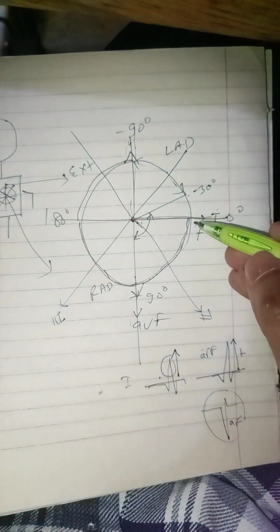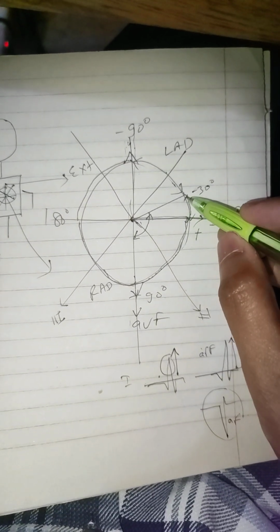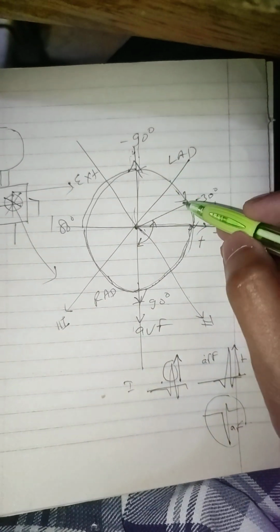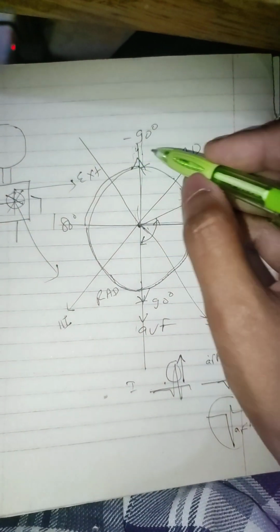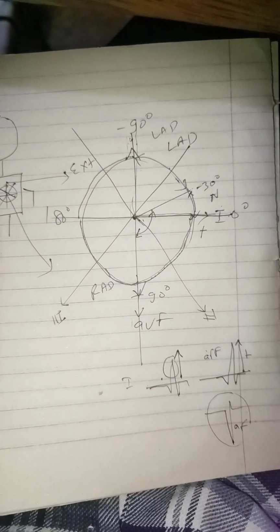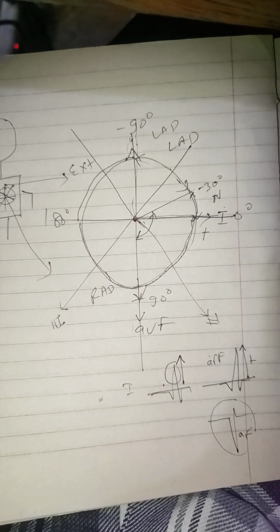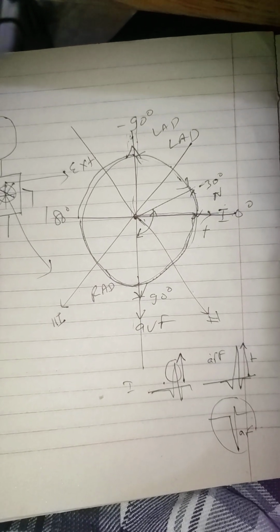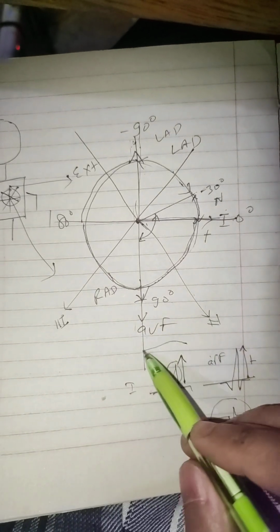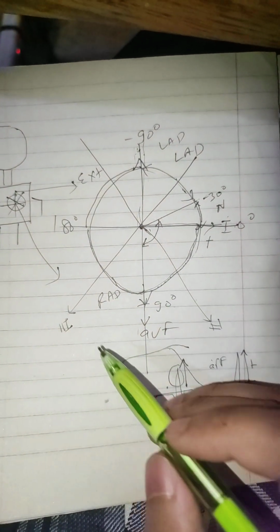So between this range, as I earlier told you, from 0 degree to minus 30 degree it can be normal axis, or between minus 30 to minus 90 it can be left axis. So here you have difficulty determining the axis, because this can be normal or this can be left axis. So how will you determine in that condition? If you face this type of situation, then check lead 2.